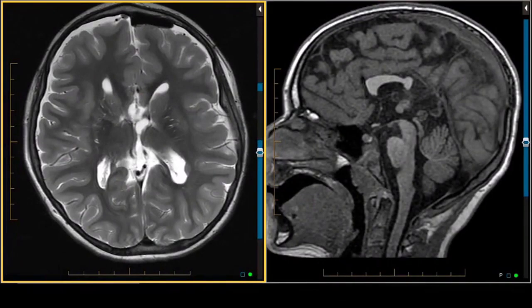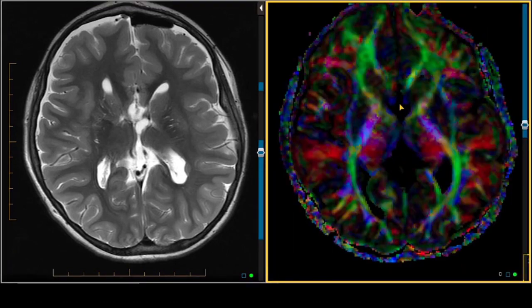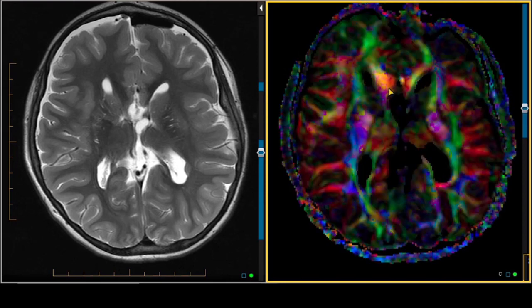and catch themselves. One of the things postoperatively we may do is look at DTI imaging. In particular, this is the directionally encoded fractional anisotropy map. Red is the color of transversely oriented fibers, and we can see there's transection of the transversely oriented fibers in what was previously the rudimentary corpus callosum in this individual.